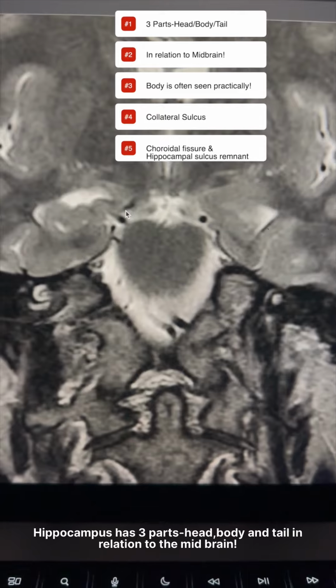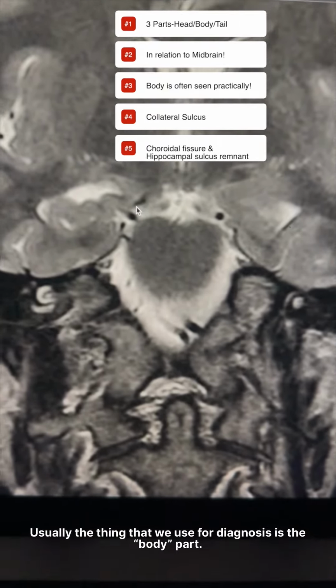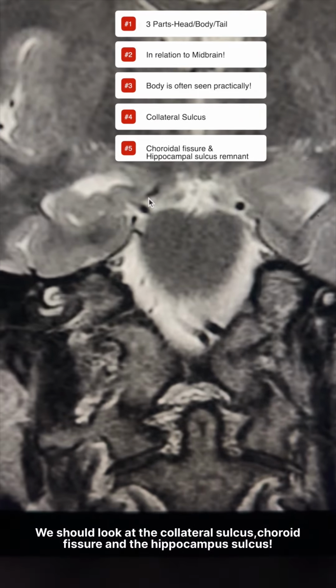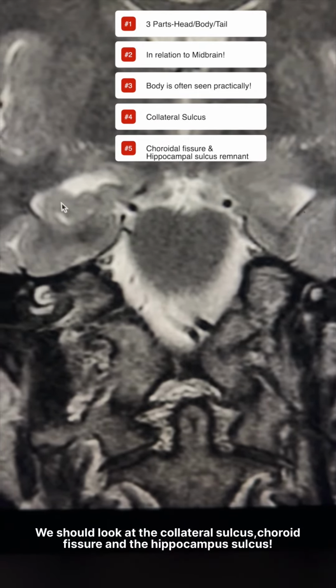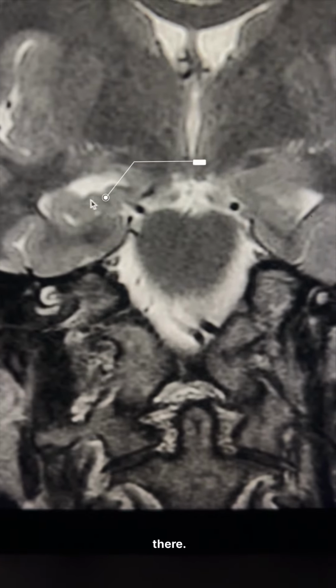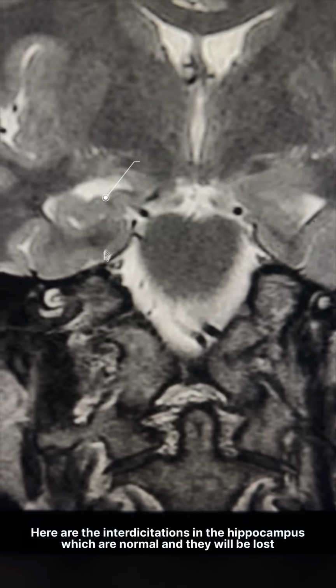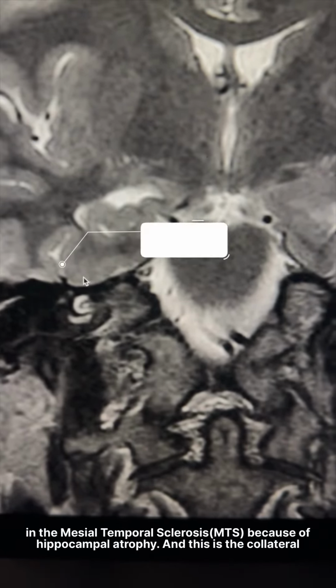Hippocampus has three parts: head, body and tail in relation to the midbrain. Usually the part that we use for diagnosis is the body. We should look at the collateral sulcus, choroidal fissure and the hippocampal sulcus because some cyst might be present there and some secondary sign of disease might be present there. The way we outline are the interdigitations in the hippocampus, which are normal and will be lost in mesial temporal sclerosis because of hippocampal atrophy.